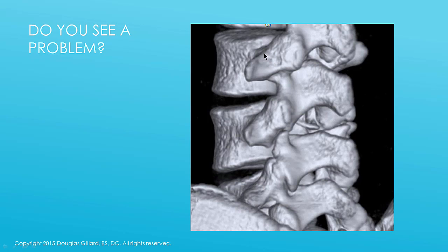But there's the eye, so that's the pedicle, this region. Here's the transverse process, this tip right here. That's kind of the nose of the Scotty dog. And then here's the neck of the Scotty dog. And that makes up the weakest part of the bone. That's called the pars interarticularis. Gymnasts and football players and people who do a lot of extension, or kids, they can actually fracture that. It can develop into what's called a spondylolysis. And you're going to see them. You're going to treat these kids.